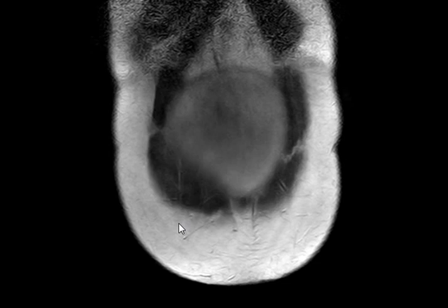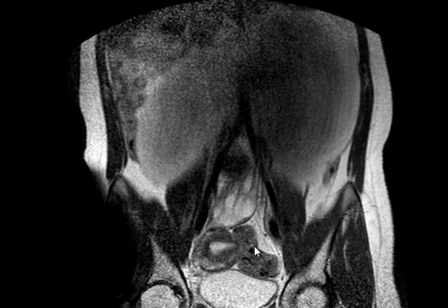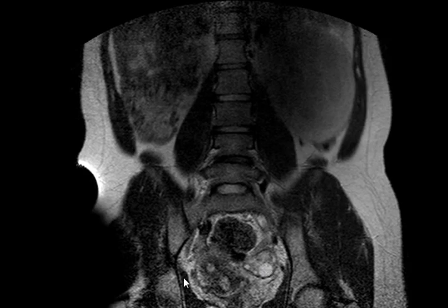This case is pathologically proven, meaning histopathology, let's say. Okay? This is a 20-year-old female patient presented with a pelvic mass. Ultrasound shows a cyst. No, go to this one. Yeah, this is T2 coronal. This is the uterus. Okay. This is the bladder. This is an ovary. Okay. This is an ovary, and where is the other ovary?